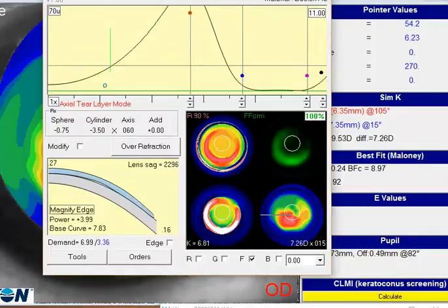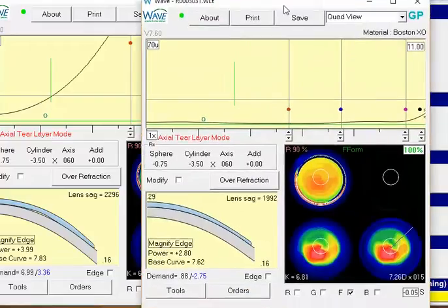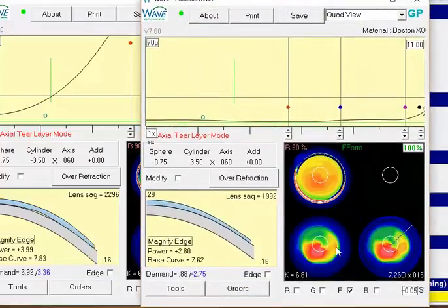So what I do in this case, I'm attempting to eliminate Wave having to do such a complicated calculation for compounding cylinder axes. I think with those couple design tips, that'll help you get these lenses performing better. I find that some of these keratoconus patients are very, very difficult, and even as sophisticated as Wave is and as great a tool as it is, I occasionally find myself just going back to just a regular spherical, old standard traditional design keratoconus lens in some of these patients.